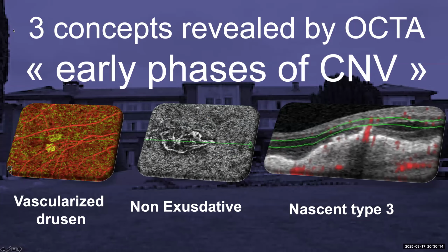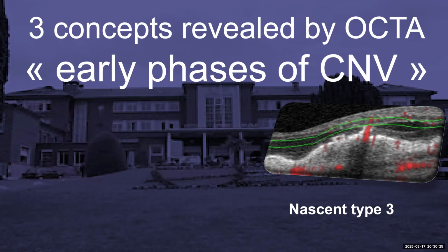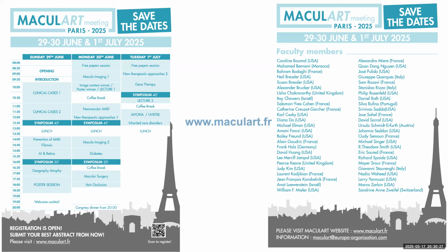So these three concepts of early lesion really emerged since the occurrence of OCTA in our practice, allowing early detection and prompt treatment.